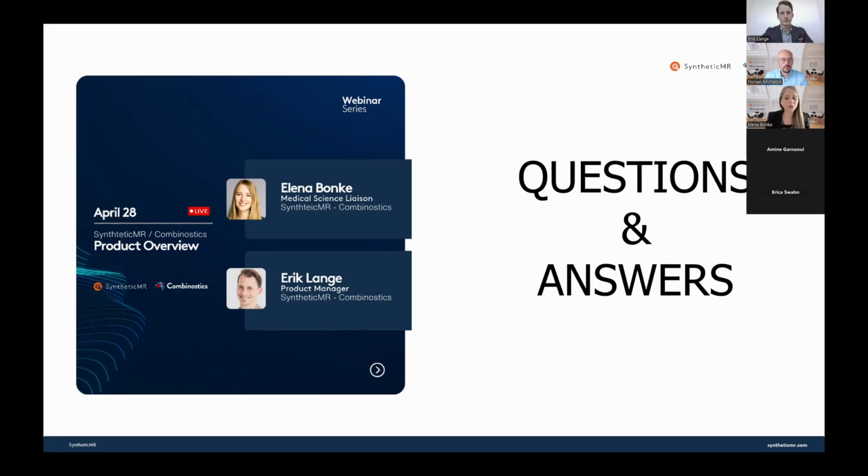Then we still produce all the reports and you can log into our web viewer, click one button and then additionally send this, for example, additional dementia report back to PACS. So this is another way of working to make sure you only receive what you need in PACS, but you then still have the possibility to check all the other reports in the web viewer.